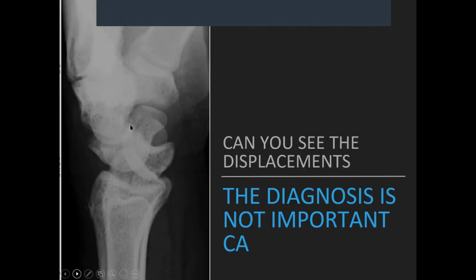And let's have a look here. So here we have the apple. The apple is not in the cup. Here we see the cup here. And is the cup in the saucer? Cup is not in the saucer. So in other words, all three elements are no longer attached to one another.